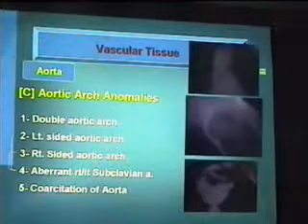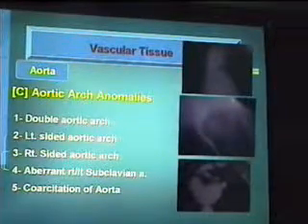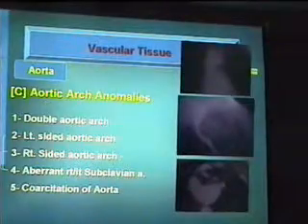And this is, أهو شايفين الأسوفيجس, and this is the indentation on the esophagus posteriorly. طيب and this is a right sided aortic arch and this is an aberrant left subclavian.